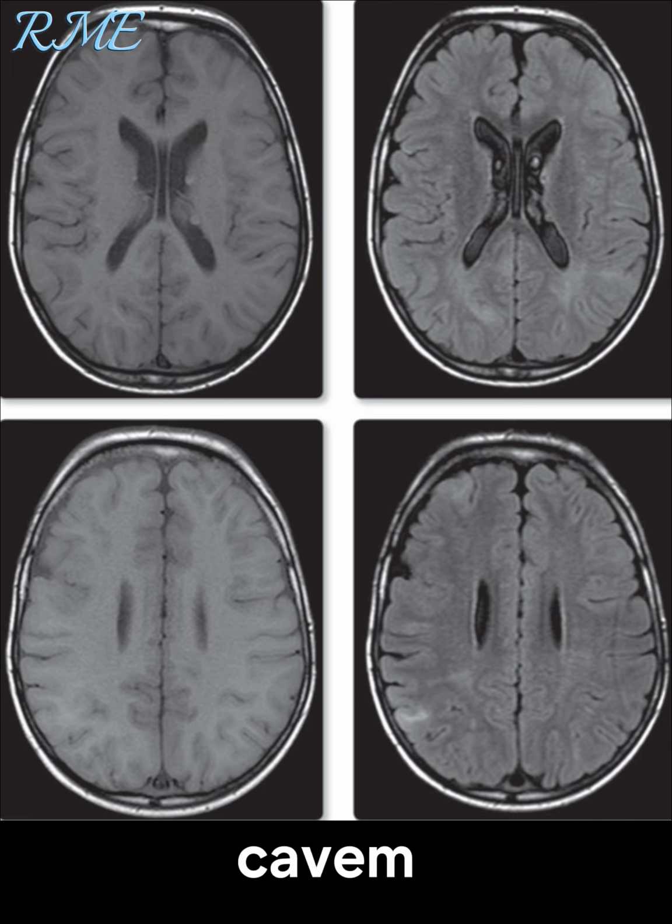I note a septum cavum pellucidum, which is a common incidental finding, but I am not aware of any association with the likely diagnosis of tuberous sclerosis. I cannot see any complications such as a subependymal astrocytoma on these images, but would of course review the whole study. So our diagnosis is tuberous sclerosis without identifiable complication.